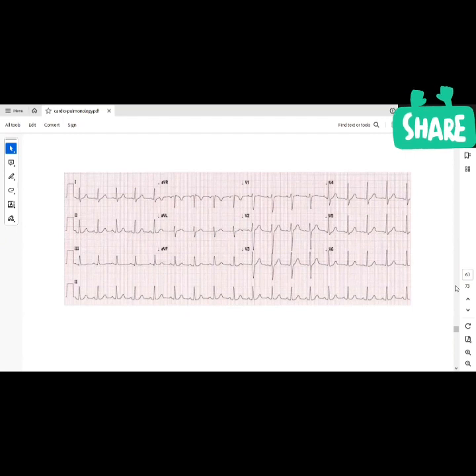And so when we talk about tachyarrhythmias, when we start talking about looking for this, looking for that, it's going to make sense. Of course, this is like a crash course. In an exam, you want to quickly do these things. It's not like what you're going to do in the clinic when you are rotating with cardiologists. So in this case, you just want to focus first on the R's, which will be the rate. Always start with your rate on ECG. I want to know the rate.